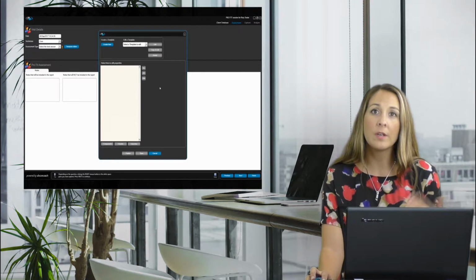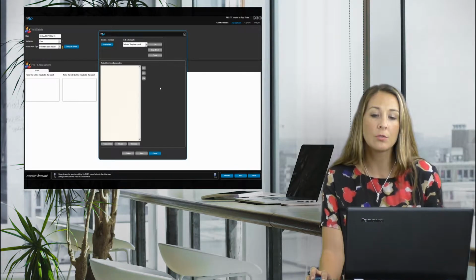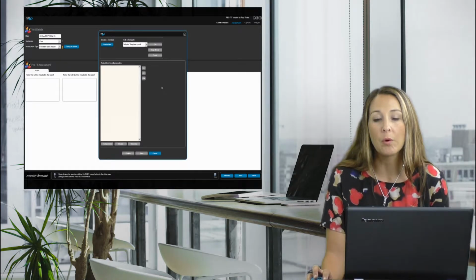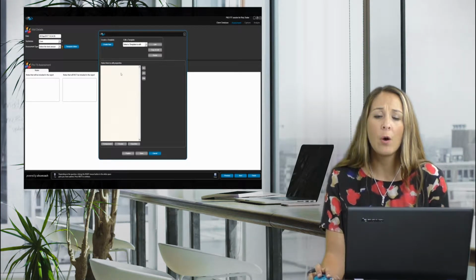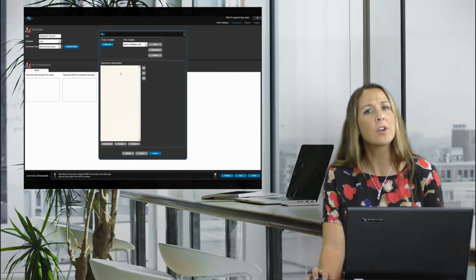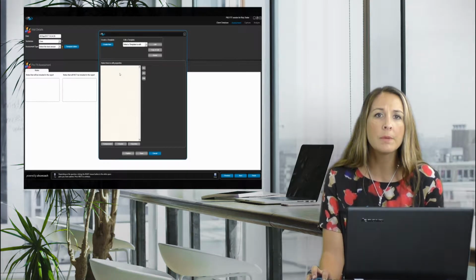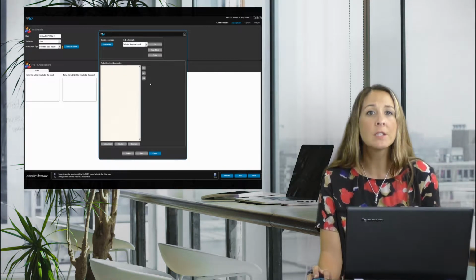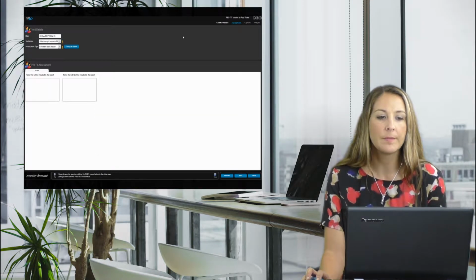So, and then it would allow you to conduct a report and to create those reports and send them to physicians just like you would the other reports. So we won't get into the template editor and how that all works today, but just know that if you're ever interested in creating your own reports, maybe creating your own outcome measure and you want to test it, this is where you would do so. And that's one of the powerful things about it.